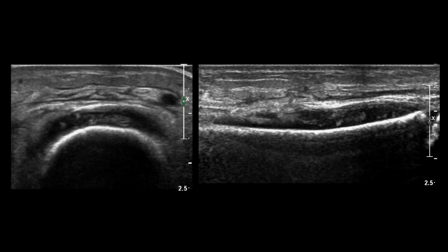So here we have two ultrasound images, longitudinal and transverse, of the distal leg on a child with swelling, looking for soft tissue abscess. And here we see the tibial bone, very echogenic, and nothing is seen distal to it because the ultrasound wave is completely absorbed by the bone, and that's why ultrasound is not good for evaluation of osseous structures. You can only see the periosteum or superficial cortex.